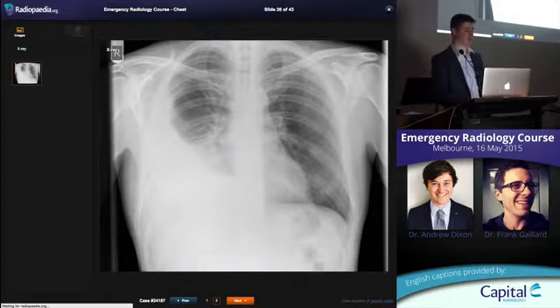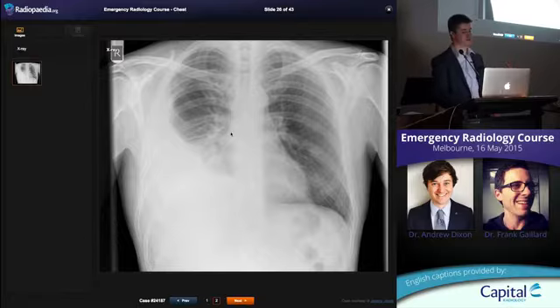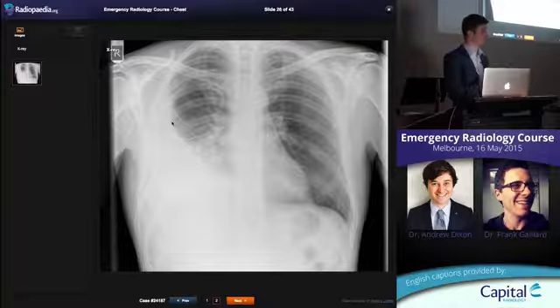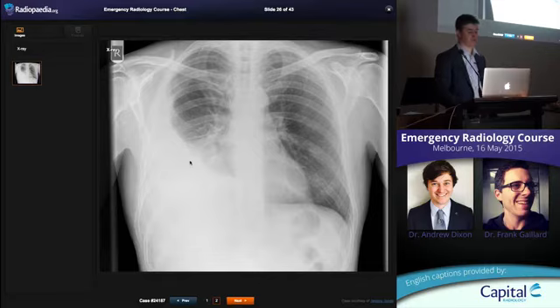So we move on to this patient who has cough and symptoms of a chest infection. This is a pleurally based density, forming a bit of a meniscus like we saw before, but you'd expect the meniscus to kind of go across like this, okay? If it was just a simple pleural fluid filling up the chest. When you start to see it forming funny shapes like this and the patient's febrile, you'd be thinking, is this an empyema in the pleural space? Is this infected? And this turned out to be a big empyema in the chest.